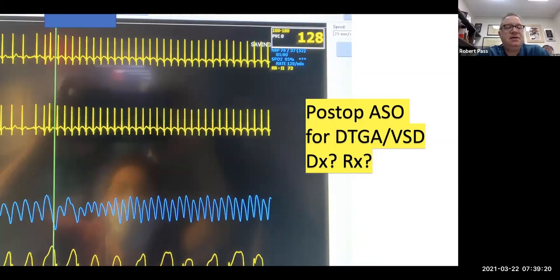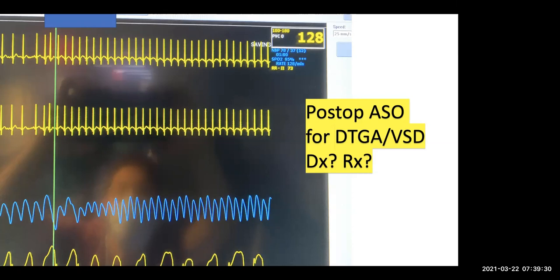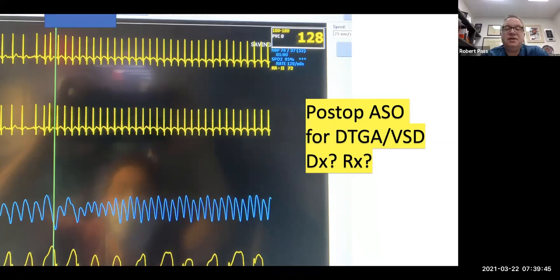So I think the reason I wanted to show this is twofold. First of all, to show you how difficult it is to make an assessment of arrhythmia from a tracing of this nature. I haven't finished, Dr. Paz. Yes, go ahead. I was also going to say that it looks different, but it could also be a sinus tachycardia and it's hard to tell. So that would also be on my differential as well. I agree with that. Very good. Excellent. Get 100% credit for that answer.